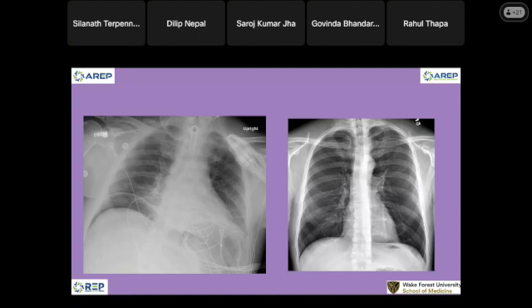You see big pneumoperitoneum. Okay, let's look at this on CT. Free air in the belly. Very heterogeneous enhancement, big mass. I have only one that is an emergency here: a coronal, and then on axial, just leave it alone. You've got to do something. So what should we do? Not the whole thing is the mass.